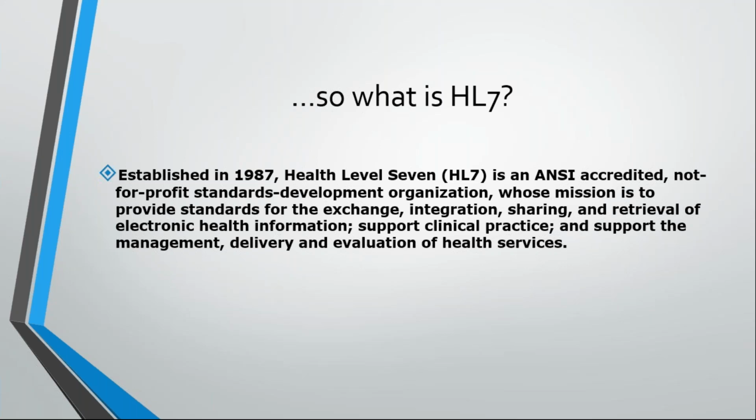use Mirth Connect interface engine to perform this entire work: extract data and generate HL7 and send it over to the other side, and also receive HL7, interpret them, and how do we insert them into the database and all.